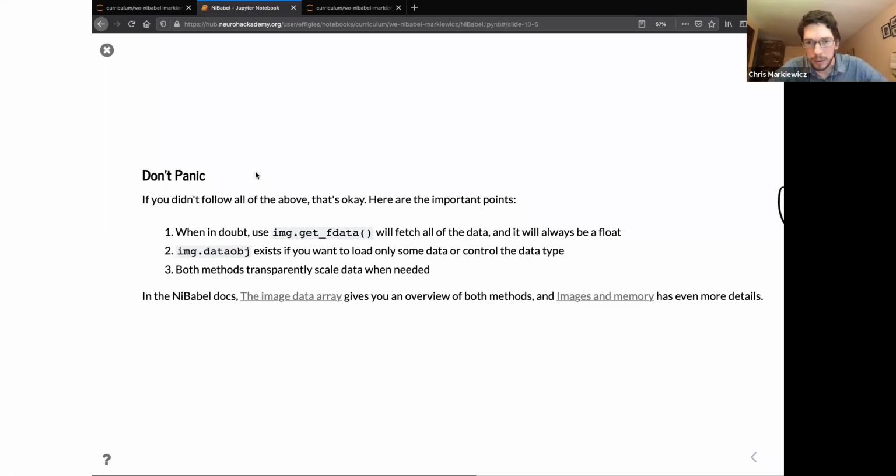Okay, so now might be a decent time to discuss what the use case is for NiBabel, or for these functions, for those creating software. NiBabel is very useful for creating software if you're writing in Python to make a tool.